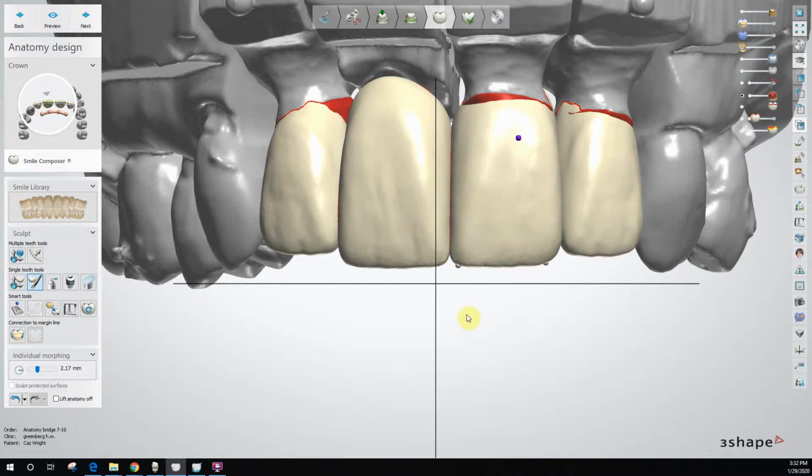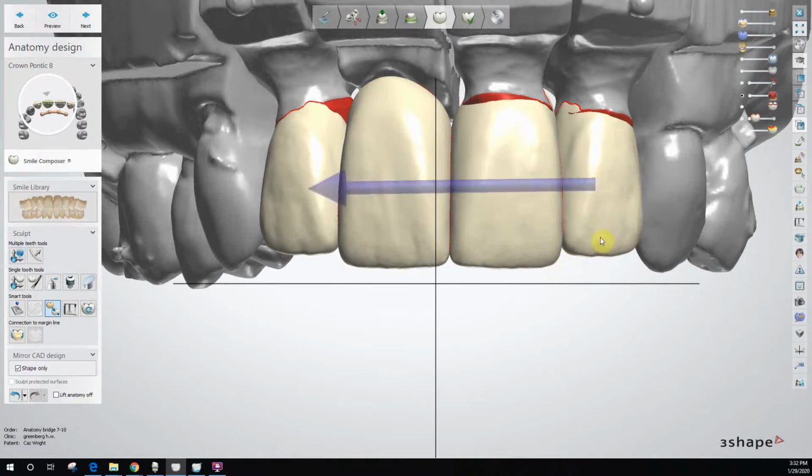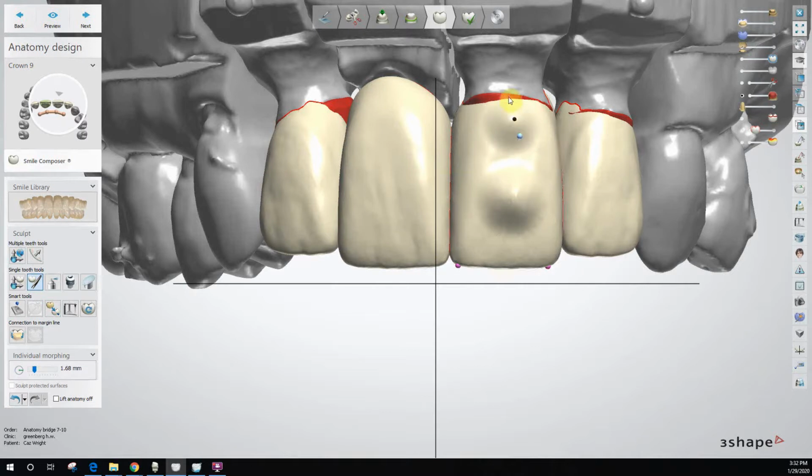There's a mirroring tool you can use, which is this one right here, mirroring, which is also the C tool. Click on that, click on the tooth I made the changes to, click the button, and all of a sudden it literally mirrors. It takes it back to 100% precision and being 100% mirrored precisely this tooth here. So for instance, just to be crazy, watch this. See? Boom. Just like that. Okay? So there's multiple tools you can use to keep things in that mirrored platform.